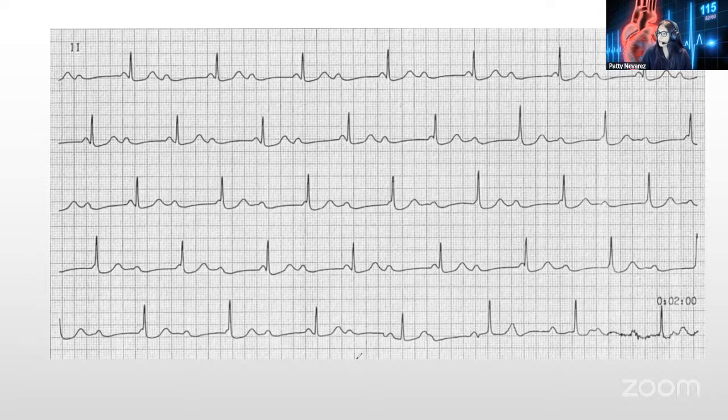So therefore, I'm going to dismiss both type 2 blocks, because one of the rules is that QRSs drop. So in this case, my QRSs are there. And I have P waves also, but I cannot recognize consistent PR intervals because they don't make sense. Look at this one, from here to here, and here to here. That will give us a cue that between first degree and third degree, the strip I'm looking at will be third degree AV block.